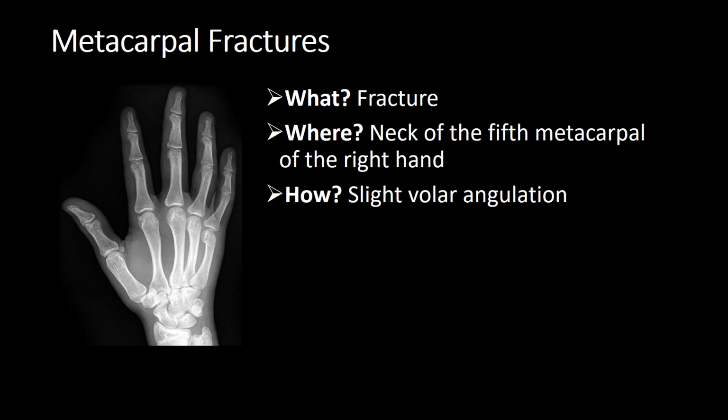So what is it? It's a fracture where it's the neck of the fifth metacarpal of the right hand and how there's slight volar angulation.